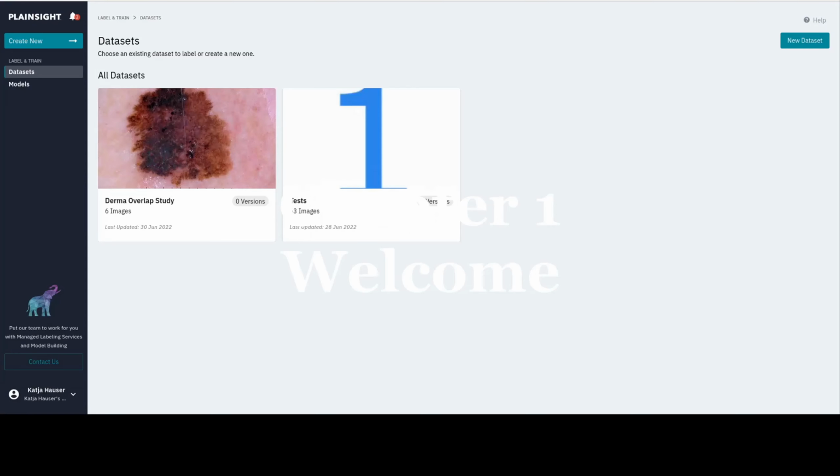Hi, thank you for participating in our study on the overlap of human and machine explanations in dermatology. In this video, I'm going to demonstrate to you how to use Plainsight. If questions or problems arise during the course of the study, please contact us by email.